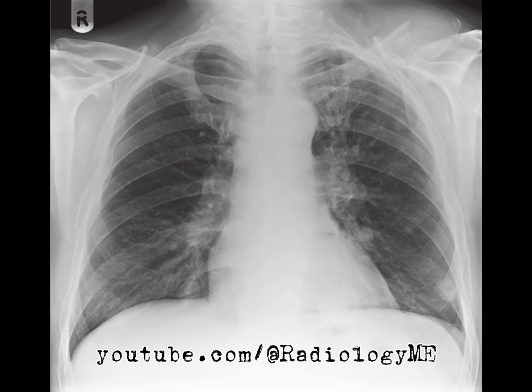Now, thinking about how the Viva examiners might push me further, they might ask something like, what makes you think this is metastatic and not something else like an infection or an inflammatory process? To that I would explain, the cavitating nodules and the destructive bone lesions really point me towards a malignancy. While infections like TB or fungal infections can cause cavitation, they don't usually cause clavicular destruction in this way. Plus, the clustering of findings, both skeletal and pulmonary, sways me more toward metastatic disease, particularly from an aggressive primary like bladder cancer.